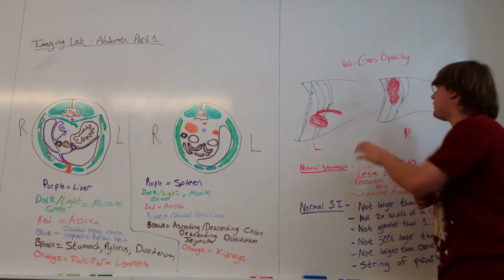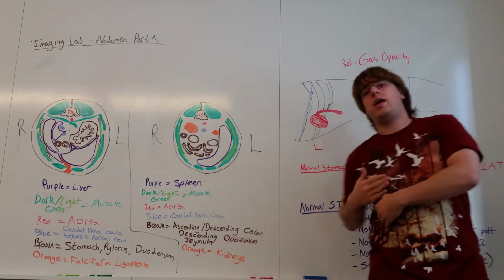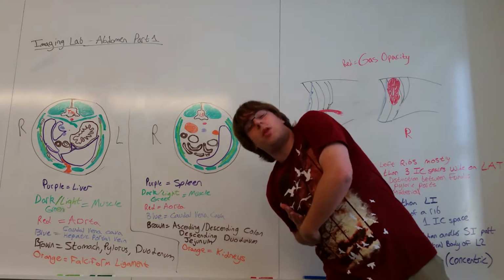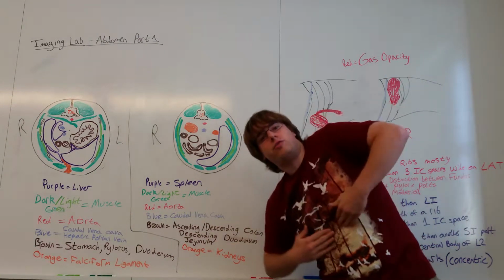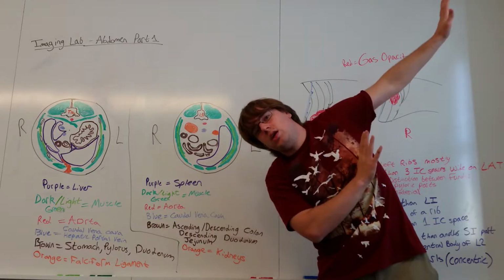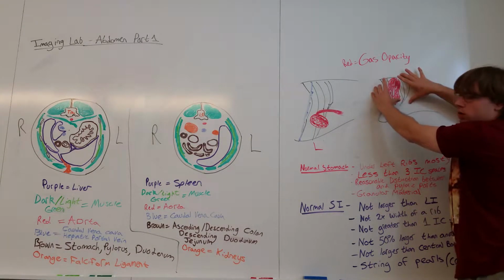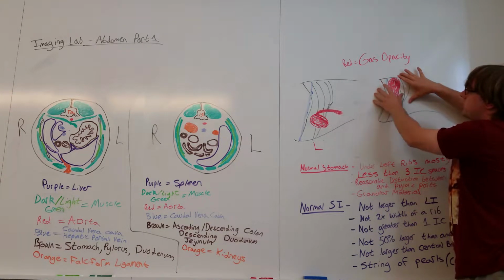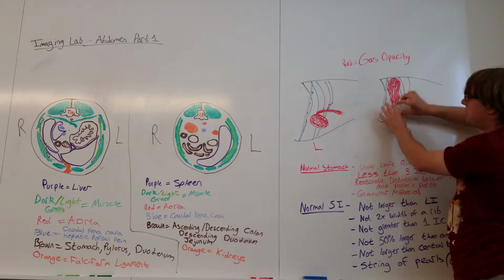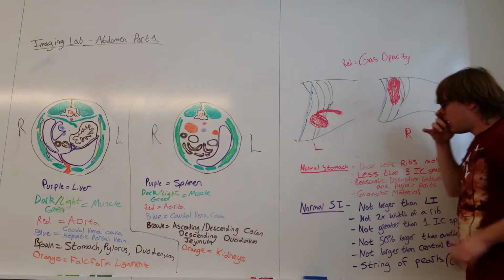On the other side, if you are on a right lateral, now you're lying on the side where the pyloric part is, so the gas is going to flow to the left and go towards the fundus of the stomach. The fundus is a more dorsally oriented part of the stomach, so you'll see gas more dorsally, and maybe a fluid opacity where the pyloric part should be over here.